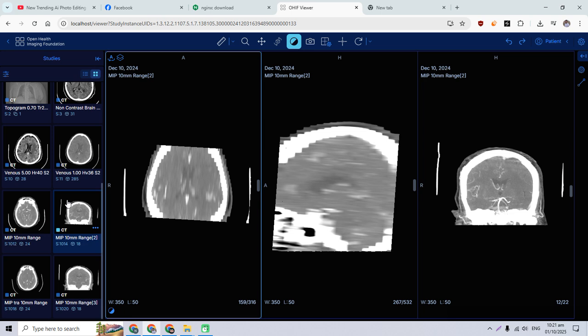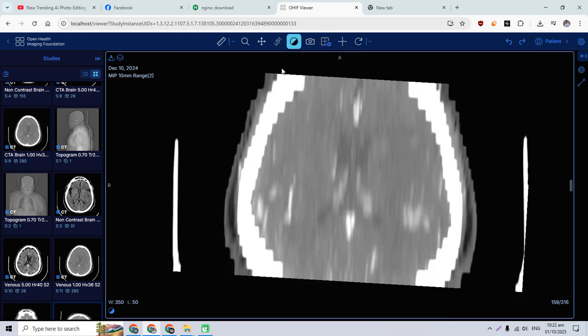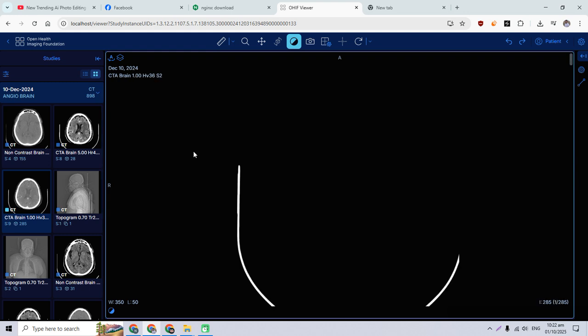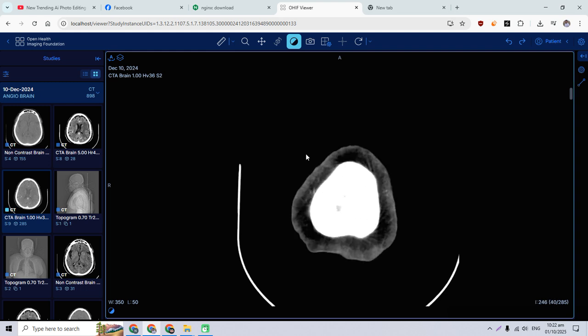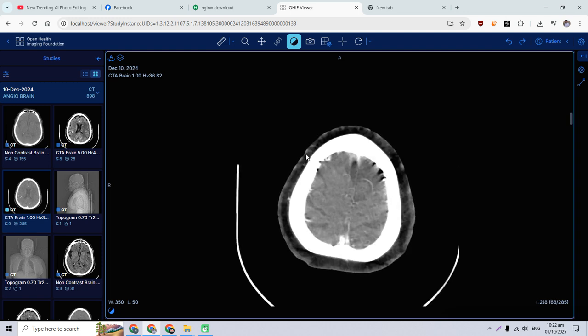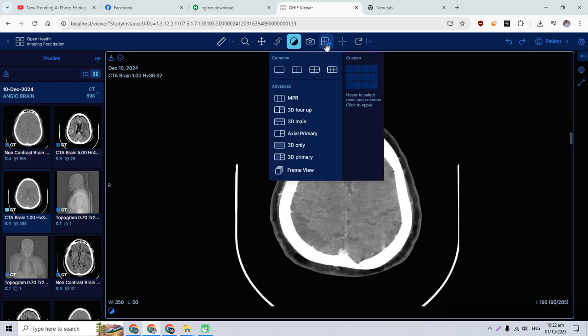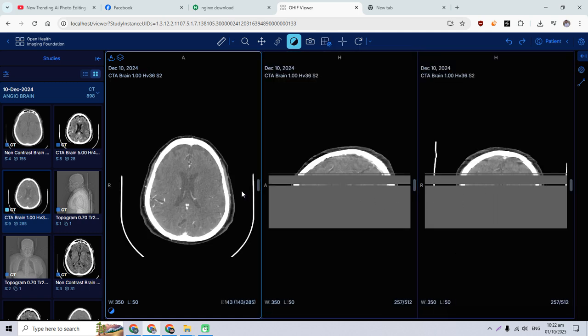So if we load the normal version, click, and angiogram, perfect, and it's loaded. You guys can see this angio brain is ready and loading absolutely perfectly from the PACS. So you can perform MPR also. See, it's performing and it's clear.